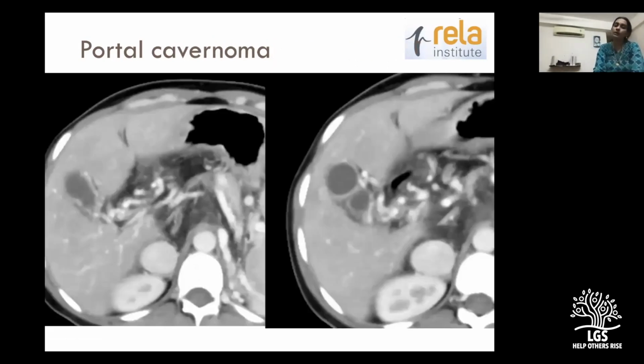Now, if there is extensive portal vein thrombosis such that it has resulted in a portal cavernomatous transformation, then that is all the more important because it will lead to a difficult hilar dissection. So here you can see we can't see the main portal vein itself. It's being replaced by what's called the cavernoma, a bunch of venous collaterals at the porta. There will be pericholedocal collaterals, and here you can see pericholecystic collaterals. So this all makes for a difficult transplant and will have to be planned accordingly preoperatively.